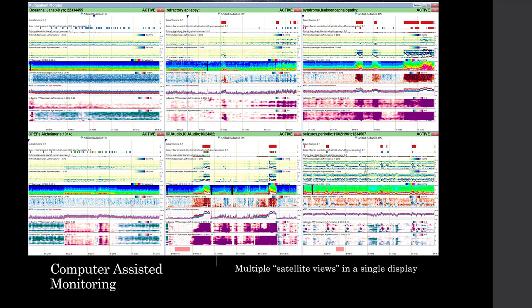And so all of these gives us some information about what's happening with each one of these patients, but not just over the last 10 or 20 seconds, but over the last 30 minutes or so, based on the monitoring environment. Typically for the EMU or an ICU, you're going to show 30 minutes to an hour for each patient. That's considerably more than the 10 to 20 seconds of history that we're usually limited to.